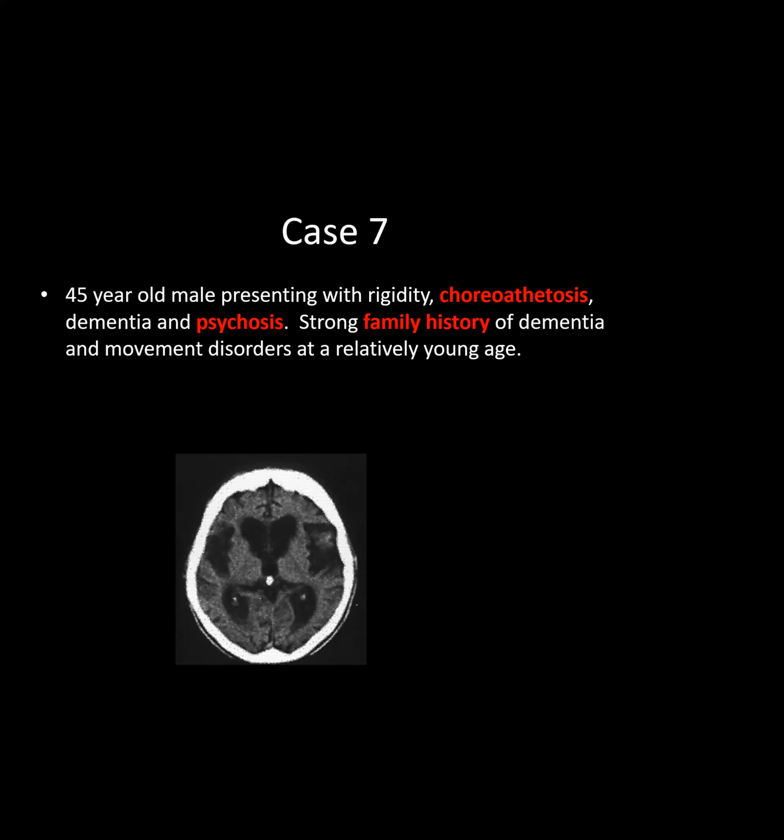Yeah, Huntington disease seems most likely. What's that? Huntington disease. Right. So just tell me what's abnormal here. I think the caudate is atrophied and there's enlargement of the frontal horns bilaterally. Right. So your frontal horn should be kind of comma shaped with the caudate head indenting it. If you look over here, the caudate's kind of small. The frontal horn is more box shaped and not comma shaped. It's a young person, so they have that plus generalized brain atrophy.